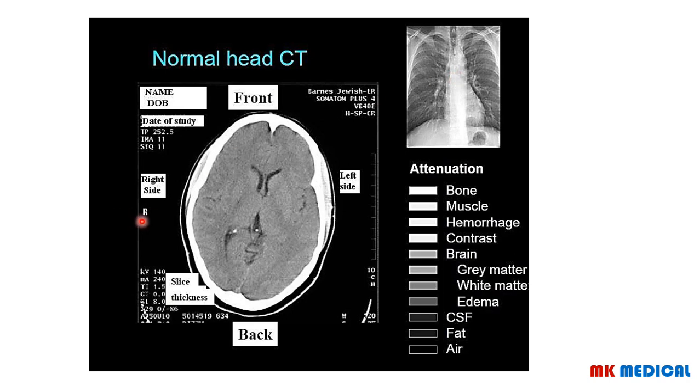So now let's look at the CT image over here. Here you have the details of the patient, the name, the date of birth, the date of the study, and then of course a few other details there.